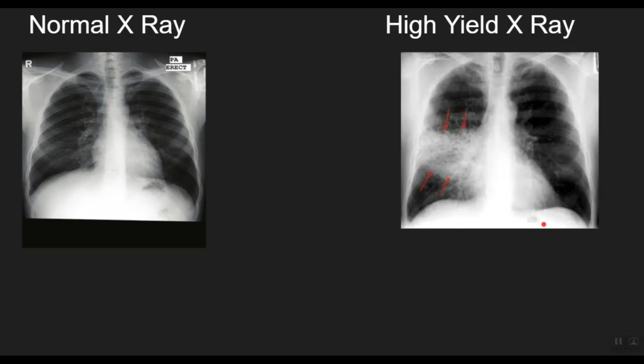Moving on to our first super important x-ray, let's say a 67-year-old patient comes to the emergency department with high-grade fever of 104 degree Fahrenheit, productive cough with rust-colored sputum, and difficulty breathing. On his x-ray, you see a widespread opacity covering the anatomical area of the middle lobe of the right lung. The exudate is so widespread that it has completely covered the right lobe, as you can see here.